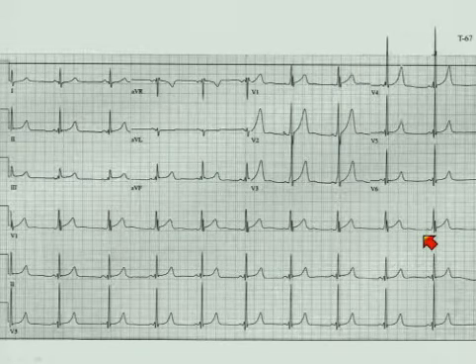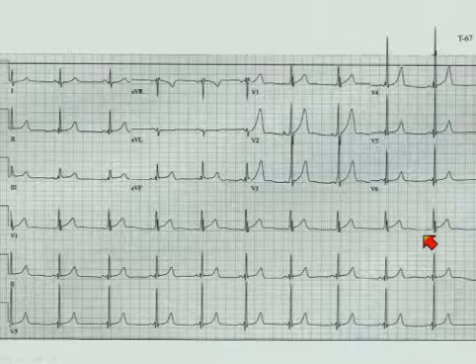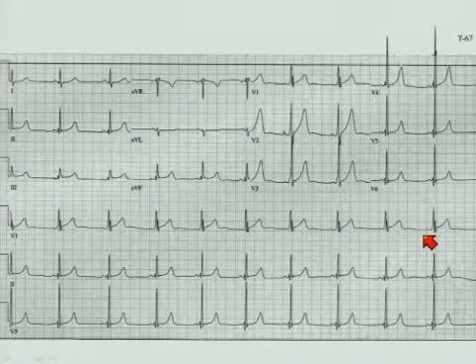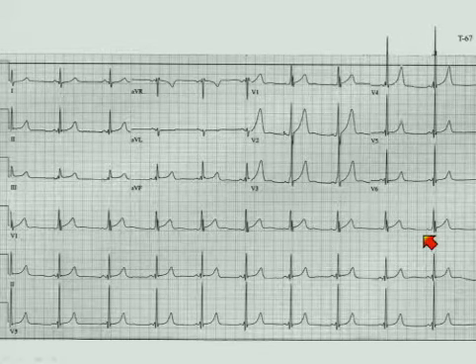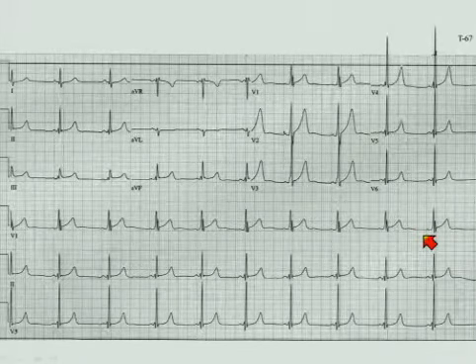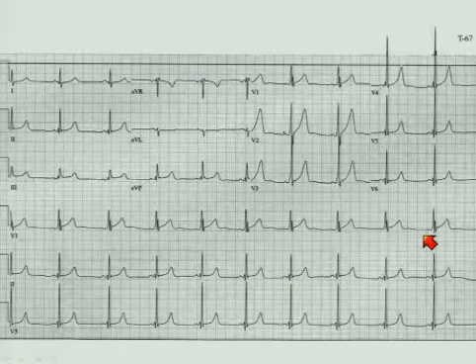Just a couple final points. Number one, for those of you taking the test, the intent of the board is just for it to be a fair examination of the kind of things that a competent clinical cardiologist should be able to recognize. If you don't try to overguess them, answer it as you would in the heart station, and then try to reconcile it with the answer sheet, you will do very well. They're not trying to trick you. When you're looking at rhythm, always measure the P to P first. Always look in the preceding T for buried P waves. And those are the most important things.